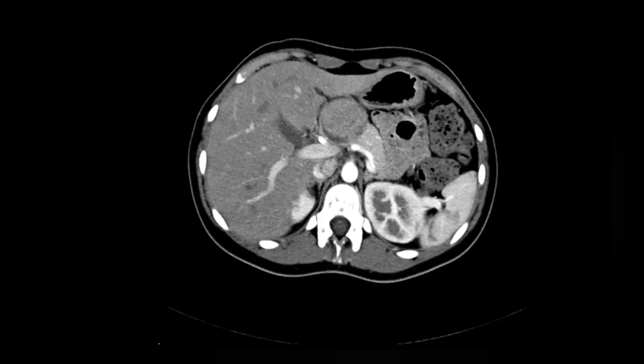I will say there is a solid pancreatic head enhancing lesion. The remaining pancreas is unremarkable. I don't appreciate pancreatic duct dilatation in the provided images. I don't see fat stranding. Fat surrounding the pancreas is clear. Vascular structures are grossly unremarkable.